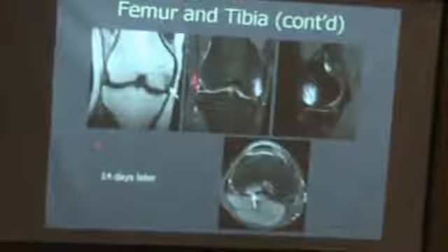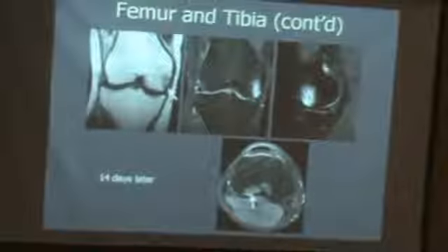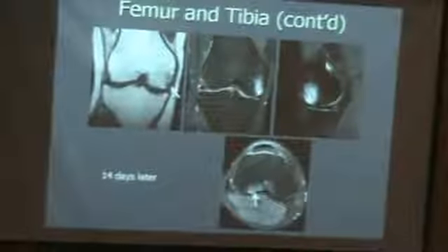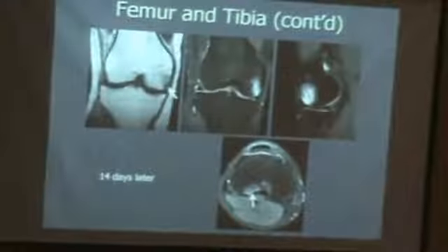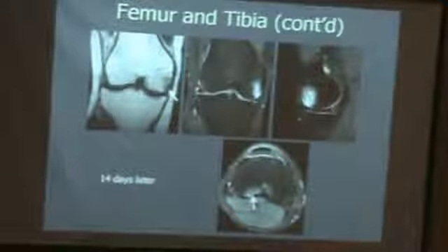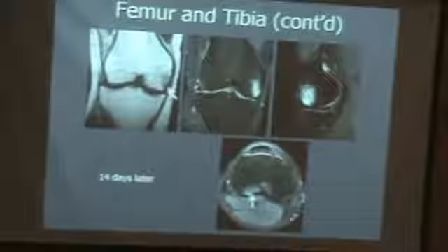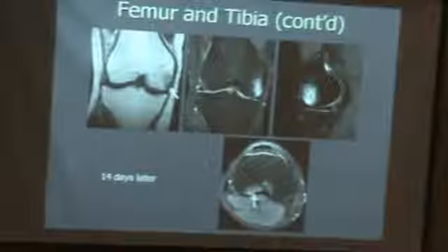But when you look at the MRI, you see the hyperintensity on the trochlea, you see the hyperintensity on the posterior lateral tibia, exactly what you usually expect. This is, of course, the medial femur. And we got a diagnosis of bone contusion. Bone contusion in my hospital is treated exactly like any fracture. They splint the patient, and tell him not to walk on his knee anymore for at least 2 weeks, sometimes a little bit more, 3 to 4 weeks. It really depends on the importance of the contusion. But this is by definition a contusion. That's why you don't see it on X-ray, and you don't see it on CT.